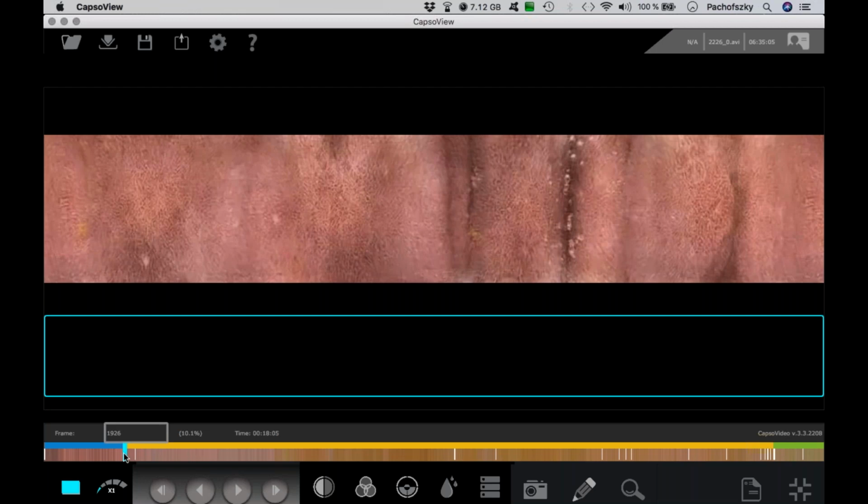If you find in the ileum, even in the younger patients, you can see these lymphoid nodules, then you're sure you're in the ileum. Also, I can tell you that the mucosa gets flattened when you come to the ileum. You have bigger and longer villi in the jejunum, and the nearer you come to the ileum, they get flattened. Another thing is that you can see more vessels.